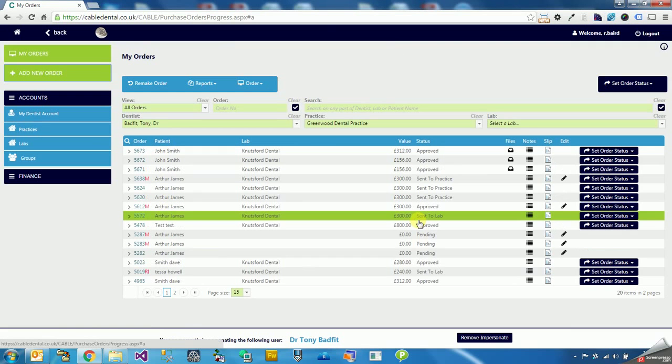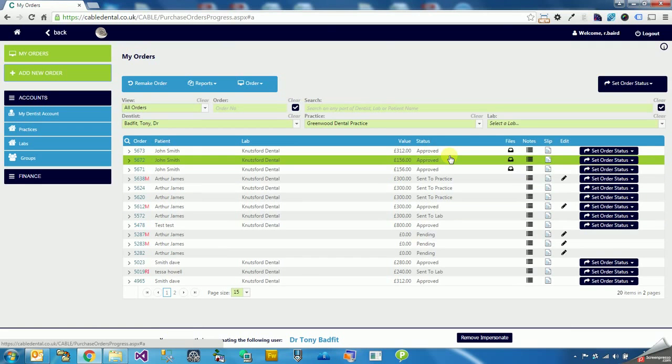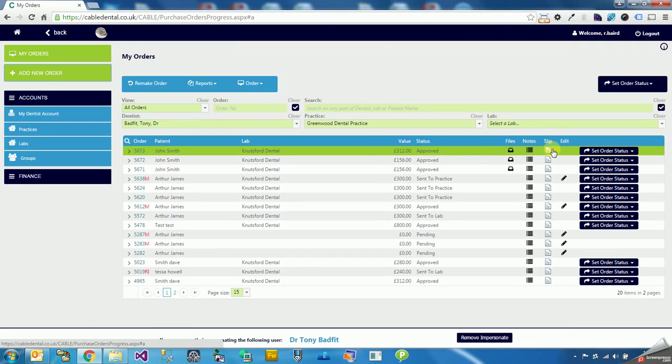So all we need to do is click proceed to check out, and literally that will create the order for us. So in this case, we can see we've added a couple in here, and for every order we can review the progress, the order details, the lab slip.